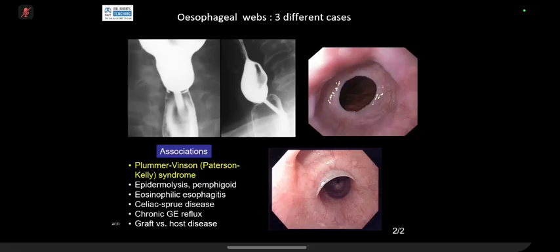And the point is that if you see this one, it is as if it is circumferential. So the barium has got minimum, the lumen has decreased. So it is passing through with what we call the jet phenomenon, right? And on the other hand, this one is just on one wall.